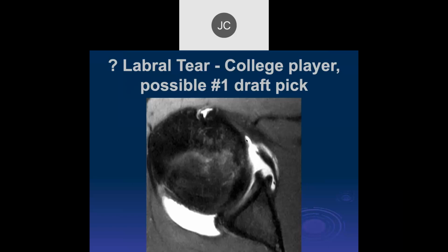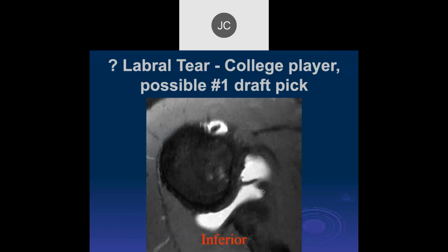I think what we're seeing more anteriorly is a thickened middle glenohumeral ligament. And the cartilage looks, what's happening there? I think the structures projecting more into the joint space are labrum. Okay. I'm not exactly sure what that is. Okay, now then, let's start from the bottom and work up.